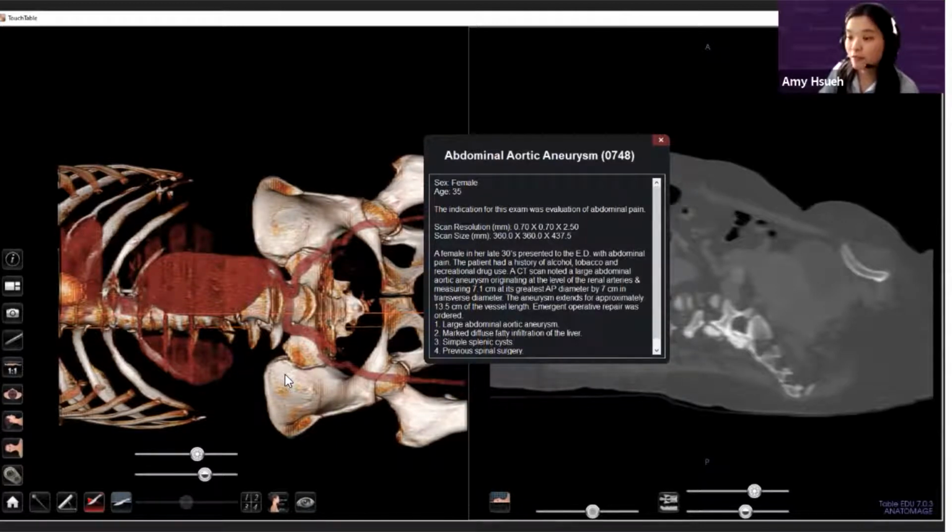We do have many new ultra high quality rendering filters that will come in our table update. So for table 8, we do have several really pretty UHQ renderings. Once those come out, I highly encourage you to take a look at those, because those ones will color them. I've seen them with purple hues and blue hues, all of that.